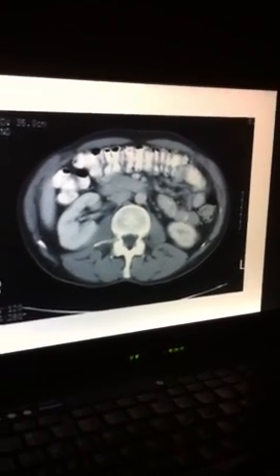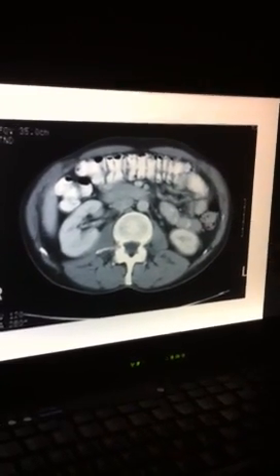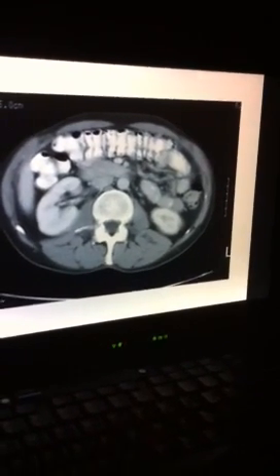Someone take a guess. Duodenum? No, you're lower than the duodenum. You're already, oh, at the right. Sigmoid? Almost the same color as its buddy on the other side. Isn't it a kidney? It's higher than the other one.